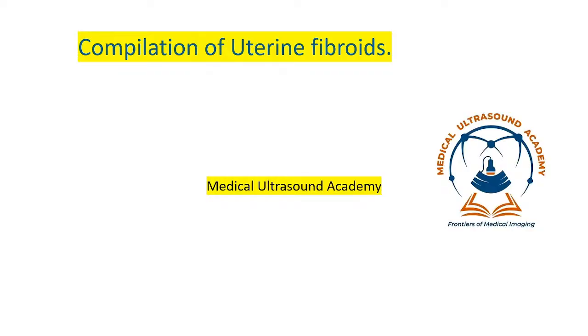So let's start to discuss uterine fibroids and their different manifestations and their sonographic appearances, so that you can have an appreciation of the different types of fibroid that you can come across when you're doing your ultrasound studies.